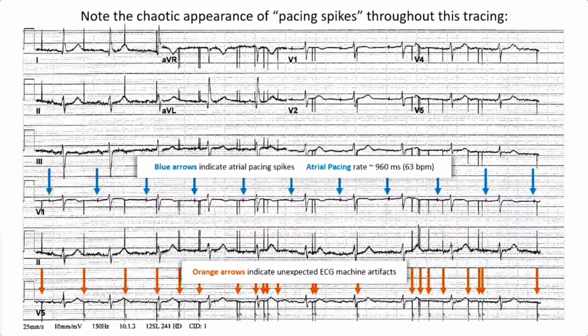How does a digital EKG machine give you this artifact? Anyone have any idea? George, you have anything to say about digital EKG machine artifacts? I'm being very careful, and I have nothing to say. We're not stepping into one of your things, Ken. We've learned too much about you.